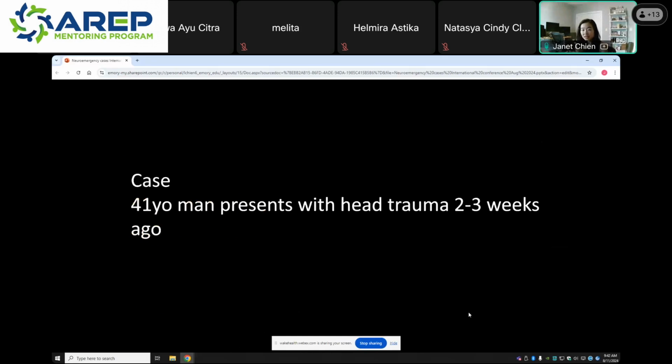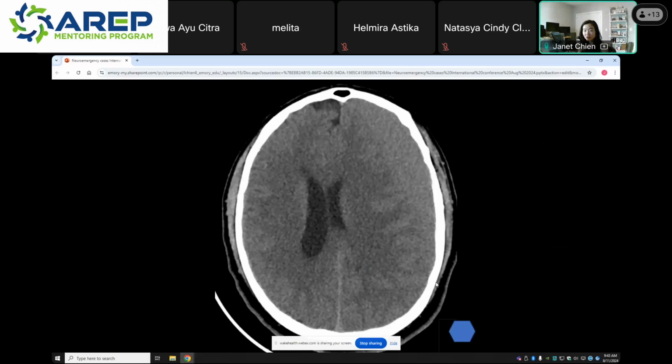All right, next case. It's a 41-year-old man who presents with head trauma 2 to 3 weeks ago. This should be a pretty straightforward one. Anyone want to type out their answer in the chat? Yeah, awesome. Subdural hematoma, great. Subacute, awesome. So it's isodense to the adjacent brain.